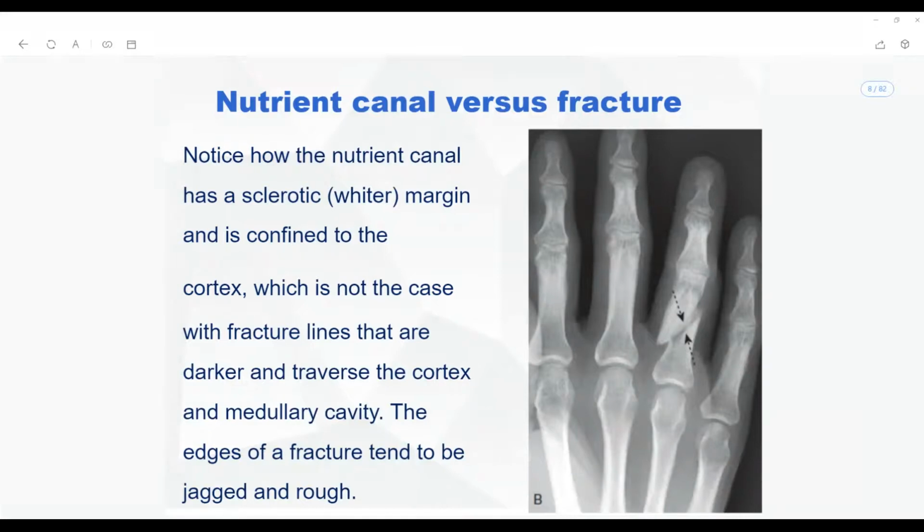Generally such kind of fractures might happen when there is stone pelting or some kind of blunt force injury that has a direct impact onto this phalanx. It depends, there are so many conditions. A direct injury, for example, maybe a weight has fallen upon him.